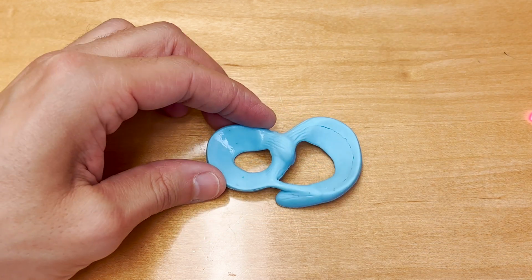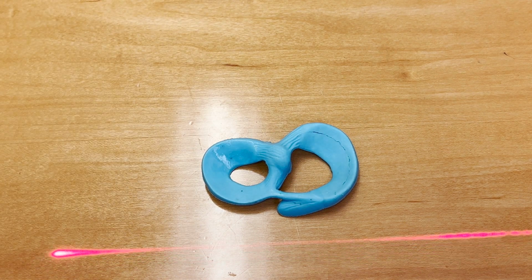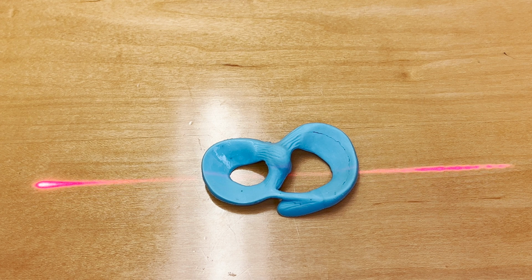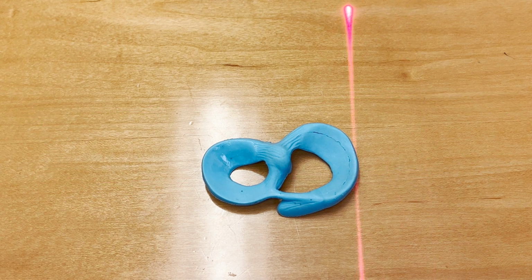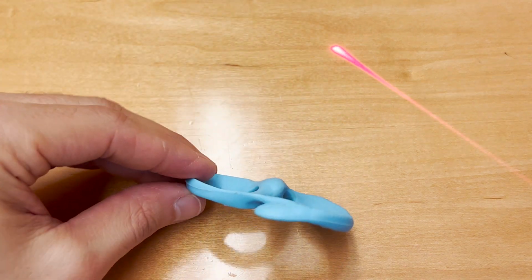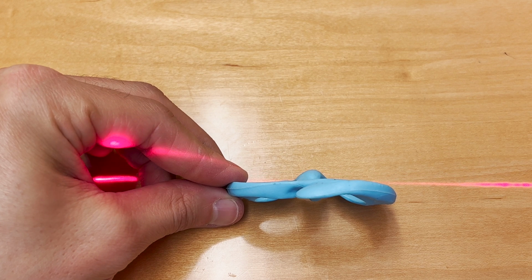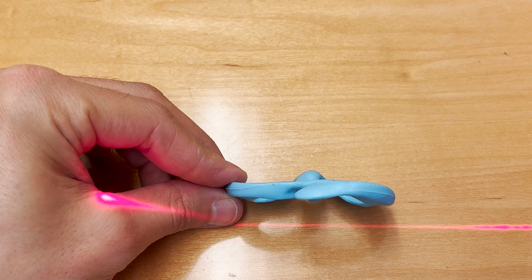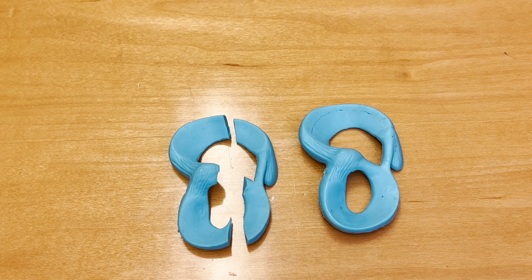Using our laser line, we can make cuts through the meniscus like this. We can make cuts through the meniscus like this. And then we can also make cuts through the meniscus top down. As you might imagine, that might make some thin cuts through the knee, just like that. So cuts from top down. All right, so let's actually see what this looks like when we make cuts through the meniscus.